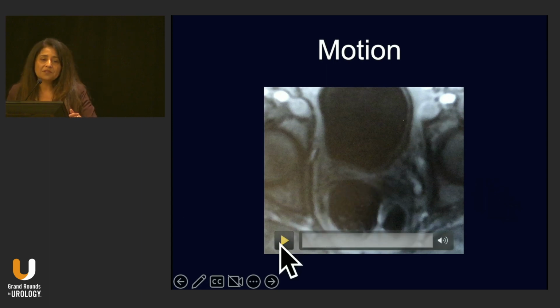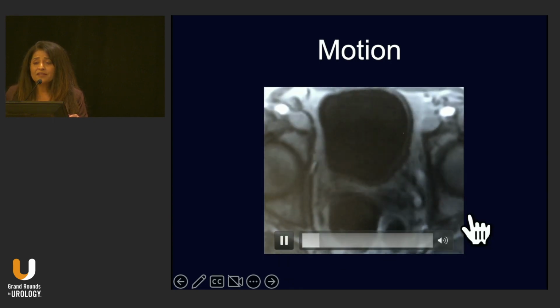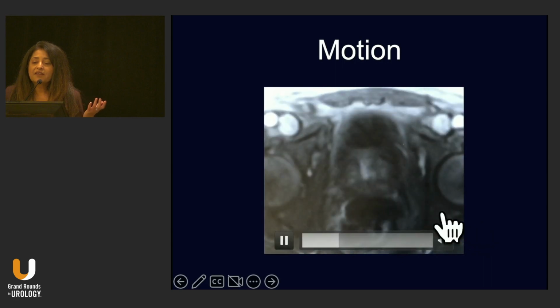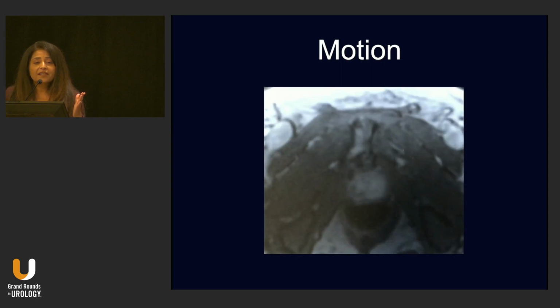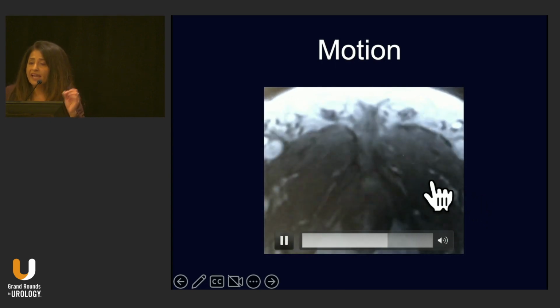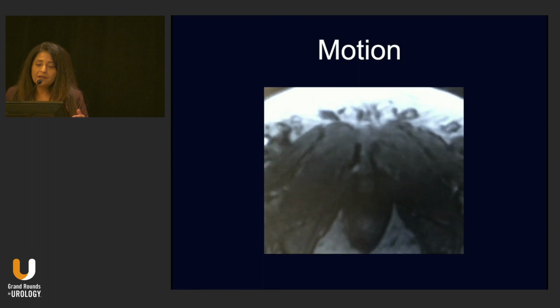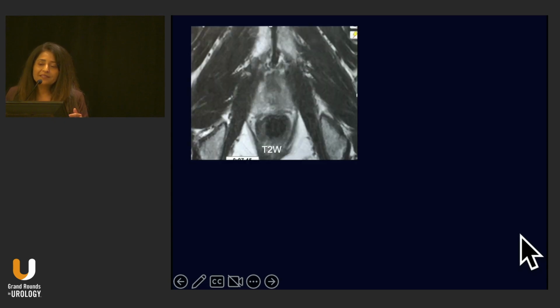Now, the other problem that happens with prostate, unfortunately, is the rectal gas. I'll show you this, because rectal gas causes so much movement, it's really like a dancing prostate, unfortunately, because look at that. The patient could be as still as can be, but with the rectal gas you'll get this, and there are many ways you could alter that. Not the best ways, but in France they put a catheter in and suck the air out during the exam. That's really not possible in most US centers. Some centers give glucagon. You can do a microenema before the exam, et cetera, but it remains a challenge.